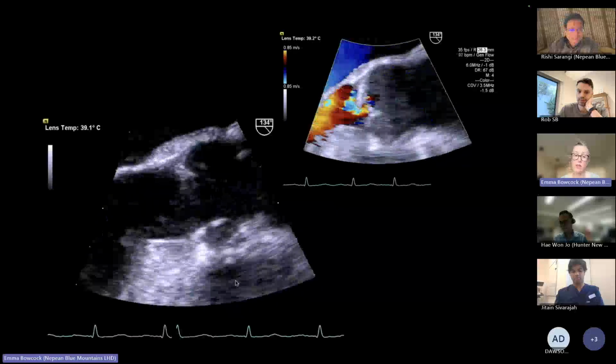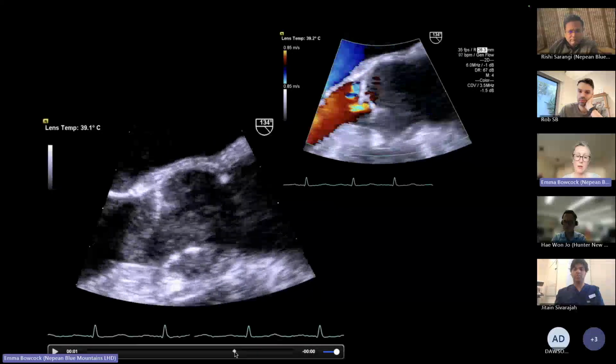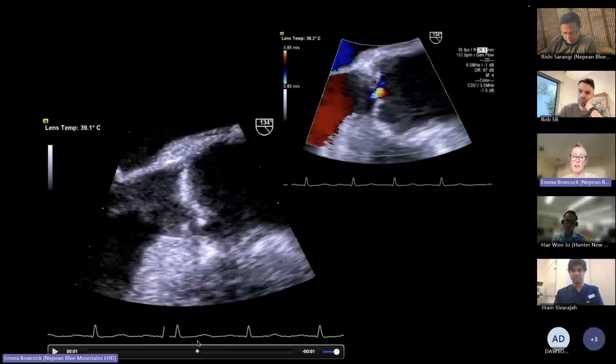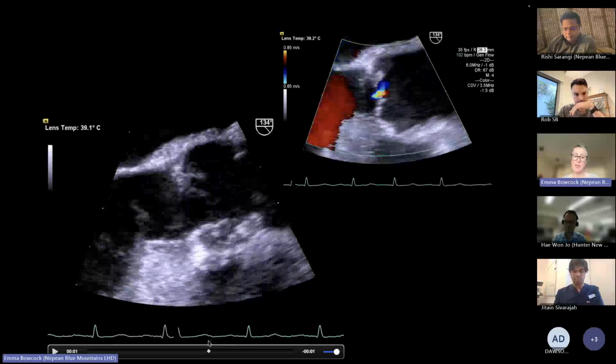So there are a few different causes, and it's a little bit tricky because we haven't got full images, but I think it's that right coronary cusp. It's got a bit of dissection material attached to it, and can you see it there landing into the LVOT? And I think that's going through with the right coronary cusp and just leading to a coaptation defect.